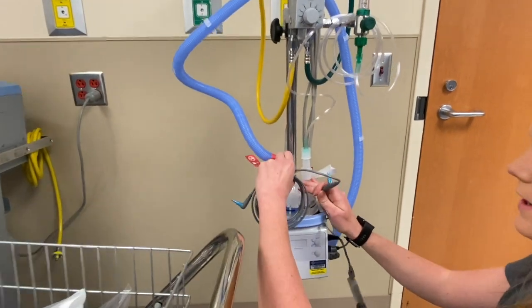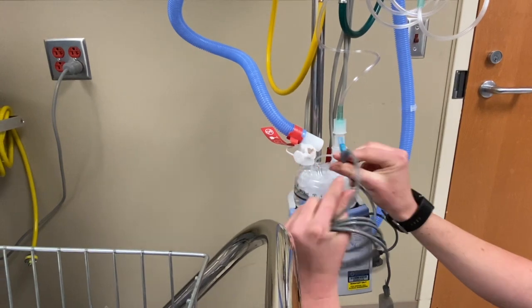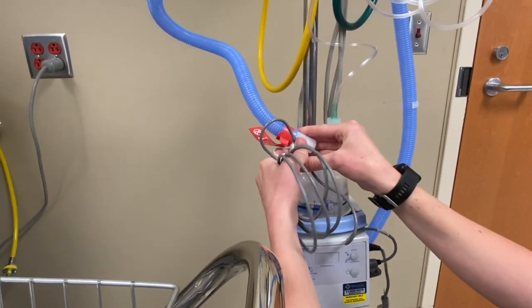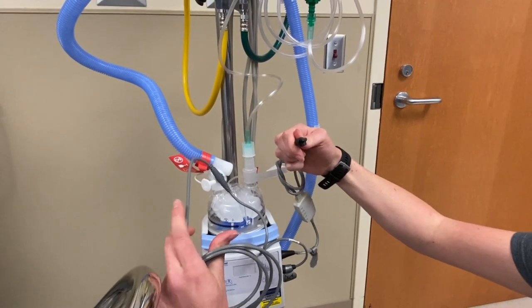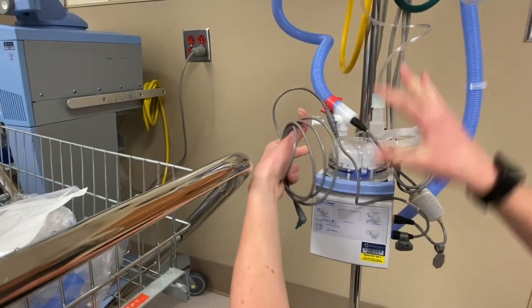And then right here you're going to pop off the cap and put this in, and there's a little V right here, and you want to match it up, and you're going to hear a click. Once that click is in, you know it's in place. Then you'll see this 3-pronged one that's going to fit right into here. That's all just connecting the heater.